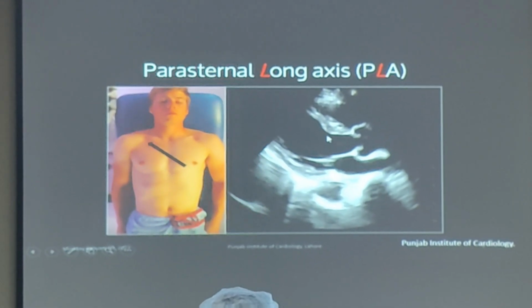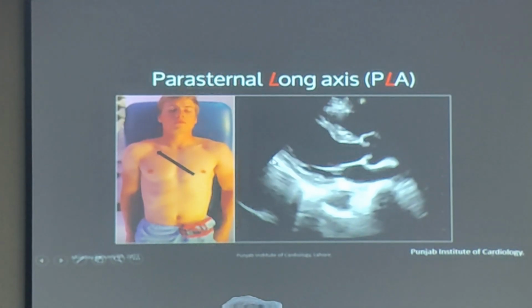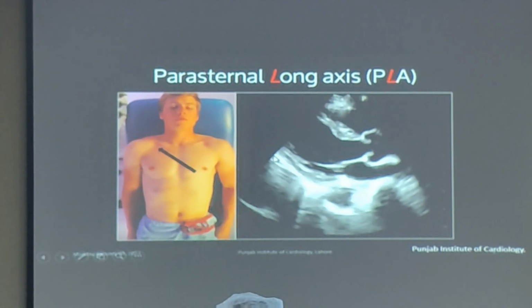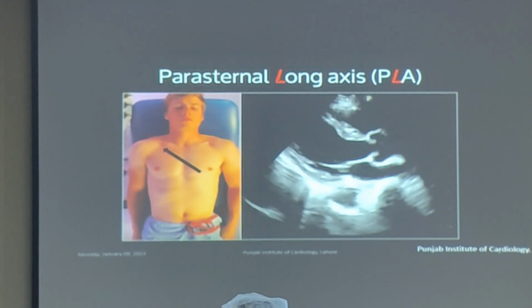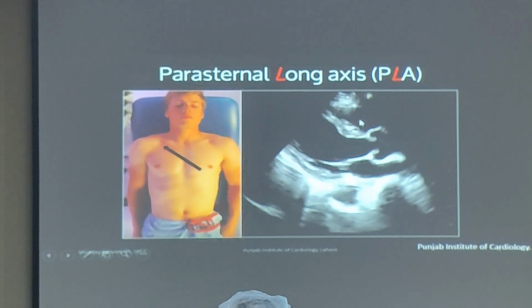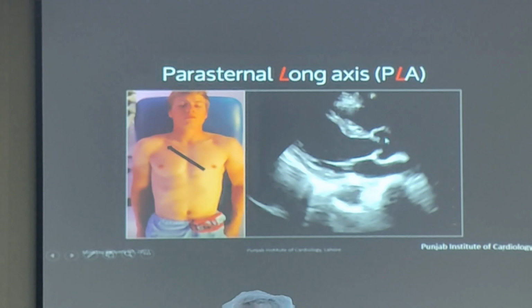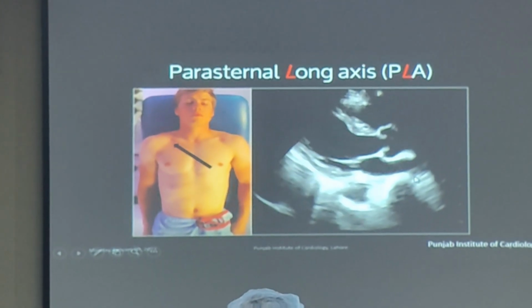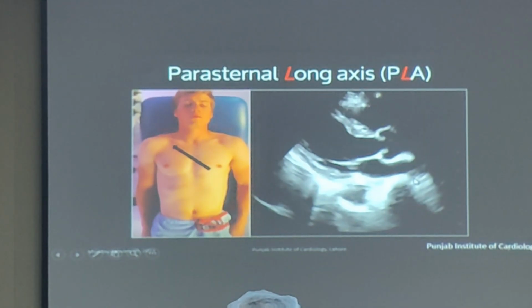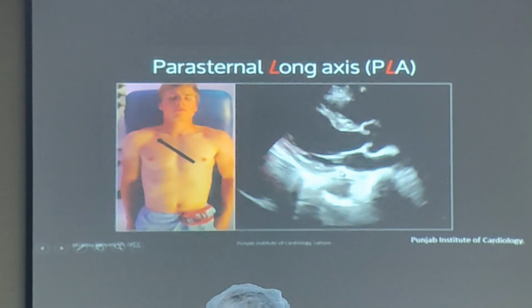This is a very friendly view, and we can measure in it. The sonographers who are doing echocardiography downstairs in room number 9, I have visited there and I have seen them, are measuring the structures in this view. They measure the RV in this view, of course the aortic root this way, and the LA in the same way. They measure all these structures, which give us the report.